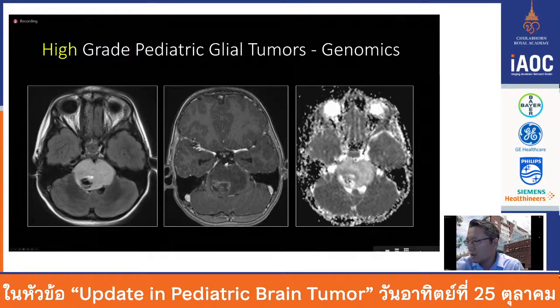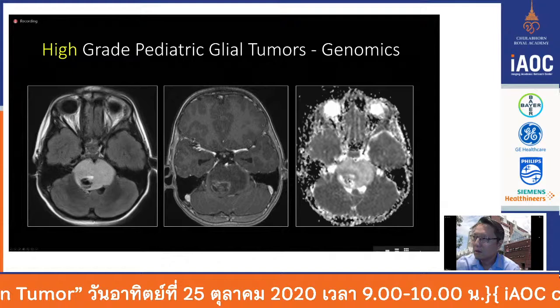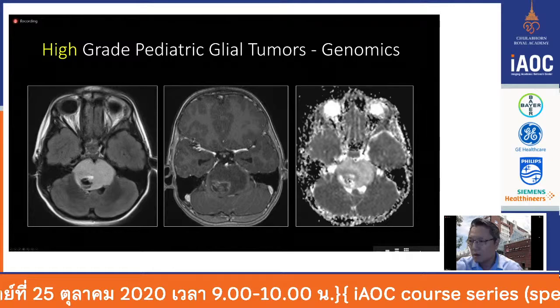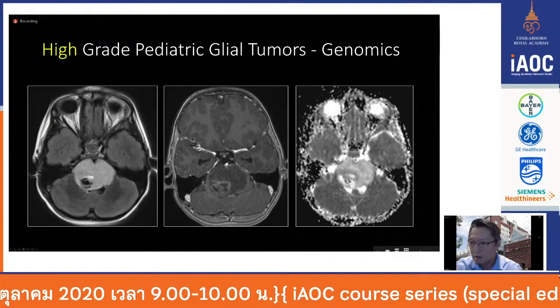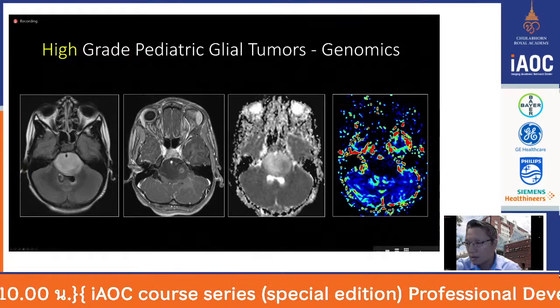So certainly, if you look at most of the tumor, it looks like it's low grade, but we all know that DIPG is a high grade tumor. Most of these children unfortunately die in a year to 2 years. Here's another case of a pretty classic DIPG. Again, enlarging the pons, circling around almost the basilar artery. Most of it's not enhancing.